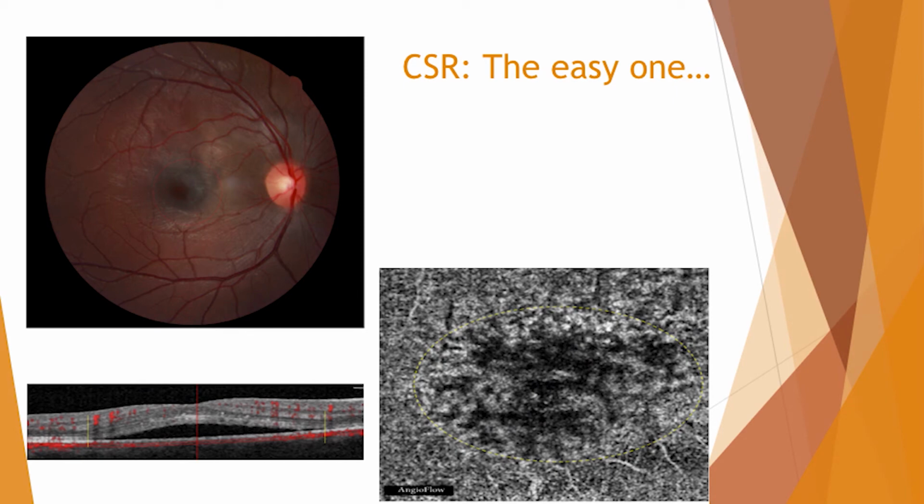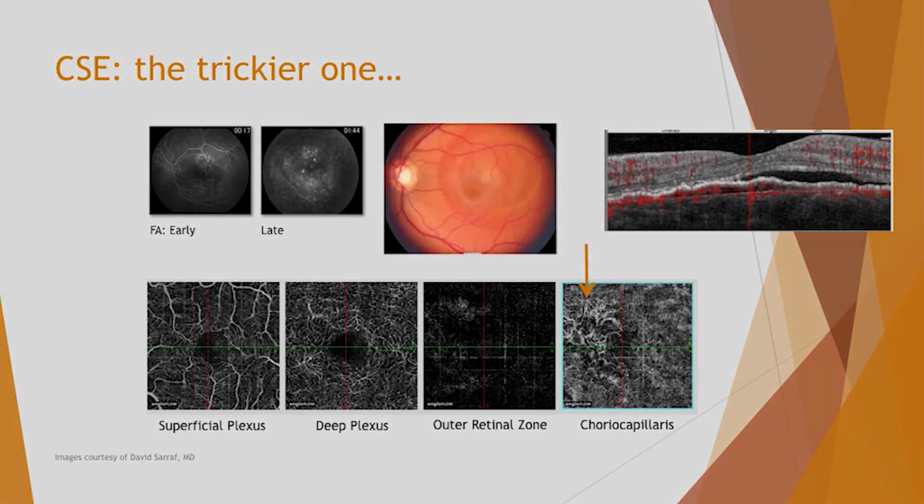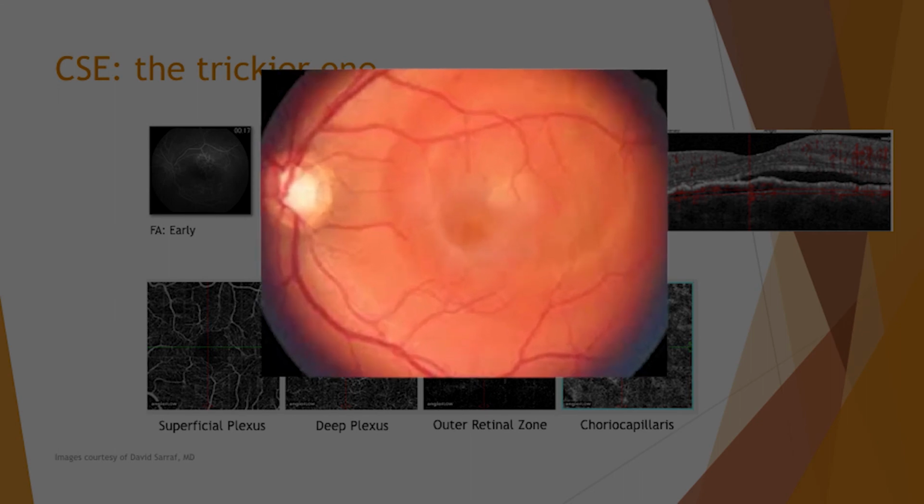All right, so here's a patient. You look at fundus exam. It looks like a big blister, but if you look at it, you can see there's a yellow area that looks a little funny, kind of superior temporal to the fovea.